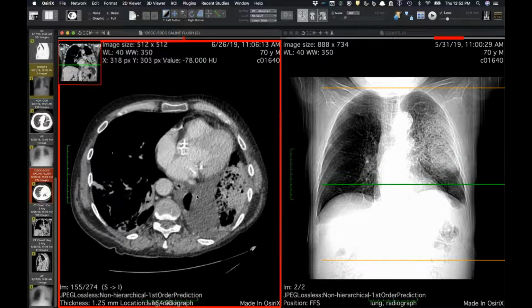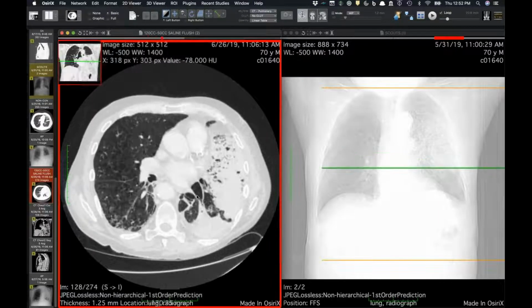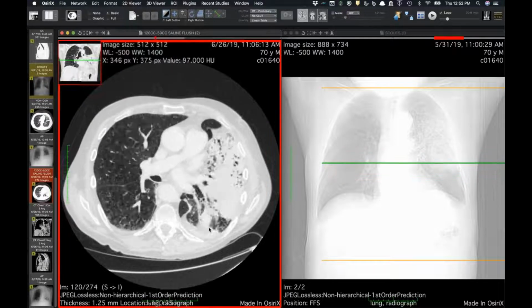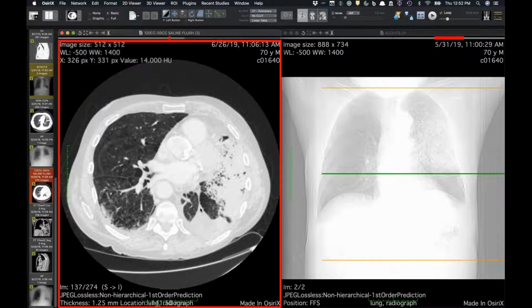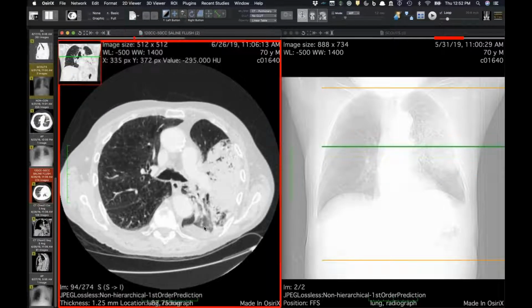So, Travis, that aerated lung in the left base on CT is left lower lobe still, correct? This is still part of the left lower lobe. I haven't been able to talk to the surgeon yet about whether there was any sort of inferior pulmonary ligament or not.